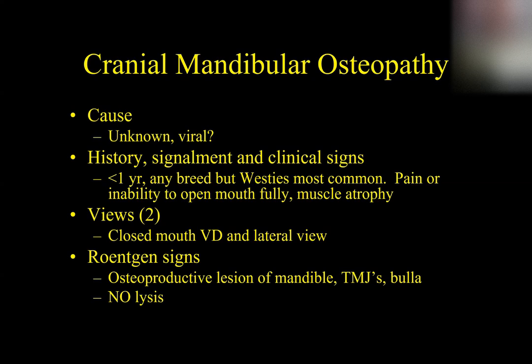They can't eat. They can't open their mouth. And now they're losing a bunch of weight. They don't know what the hell's going on. And it's a Westie. This one is very good to find with radiographs. Radiographs are very sensitive to find dogs and make this diagnosis with craniomandibular osteopathy.